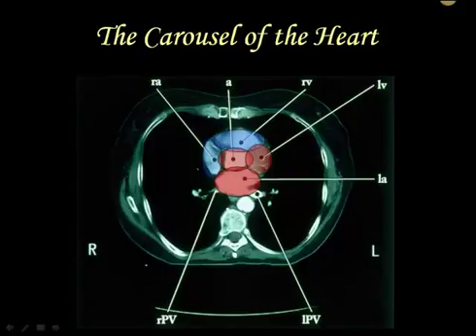This is a very old CT scan. What I've done is outlined with blue the areas where blood flow is going to be unoxygenated, that's the blue parts, versus the oxygenated parts, that would be the red parts. So, for example, it's going here into the right atrium, which is over here on the right side, minding its own business. It's here, just like on a chest x-ray. But it's going to flow into the anterior chamber here, which is the right ventricle.